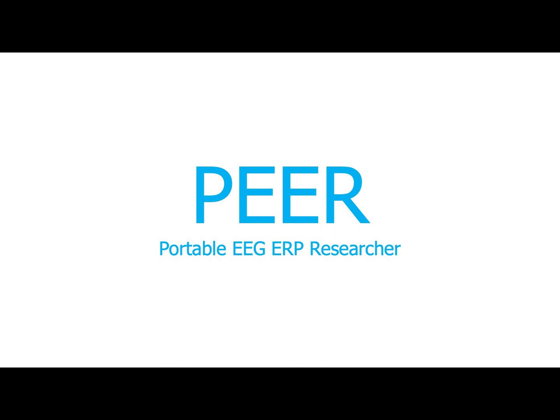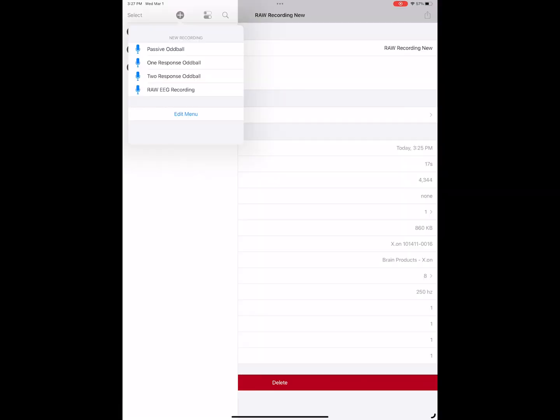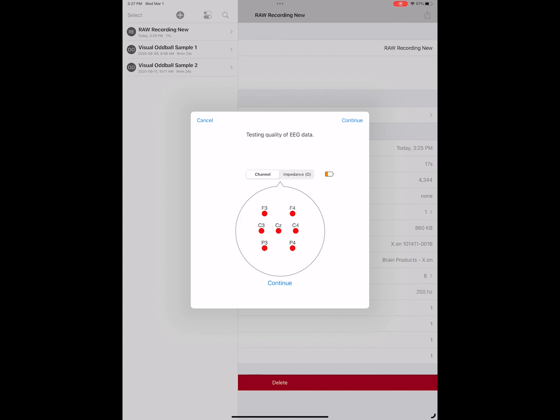Welcome to Peer. In this video, I'll show you how to run ERP studies using Peer. We'll start with a simple visual oddball paradigm. Peer comes with some pre-configured ERP studies. Here we selected one response oddball.